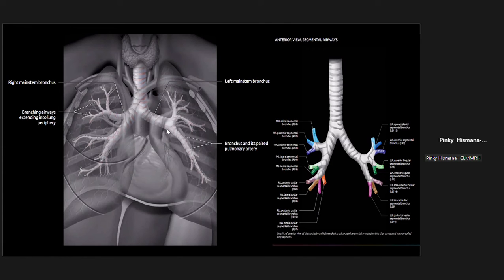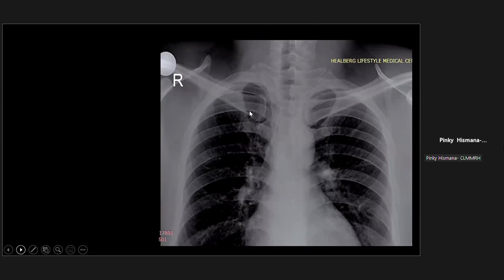So this one actually just shows you the superimposition of the structures, highlighting your trachea. It's really quite difficult to find an X-ray which has a well-delineated trachea, but as you well know, when we talk about trachea, what's inside it is air.